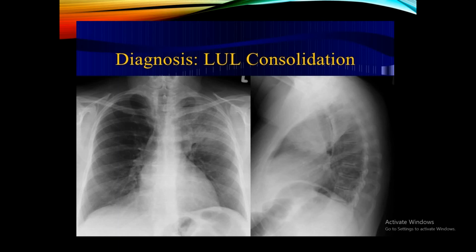لو نجي إلى lateral chest X-ray نلاحظ أنه فعلا we have the oblique line. هذا الأوبليك line يمثل لنا الأوبليك fissure، و anterior to it there is an opacity representing the patchy opacification in the upper lobe.